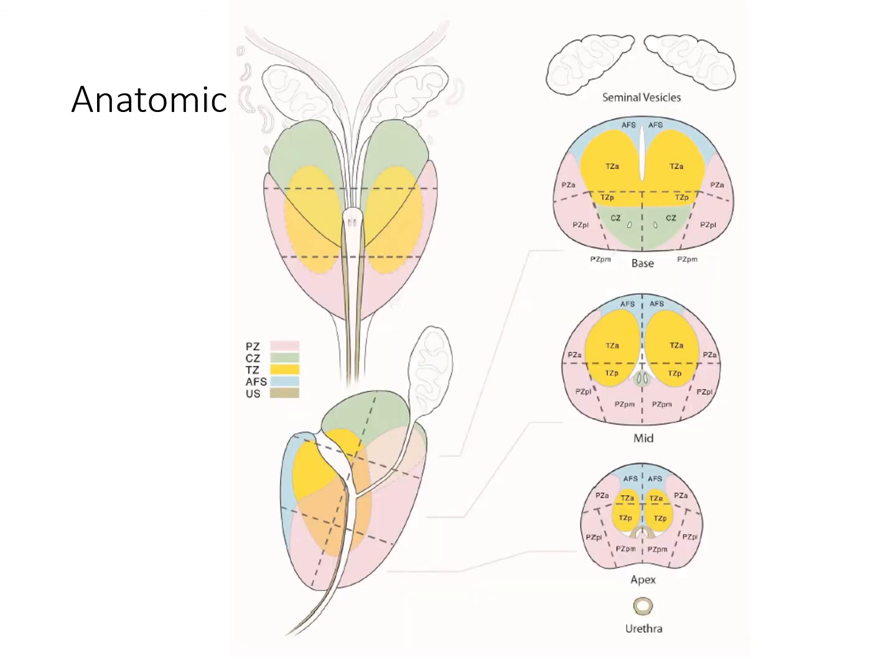Okay, so the next important thing which PIRADS emphasizes is the anatomical localization. They have this multiple sector map of the prostate gland, and when you describe a lesion, you should precisely localize it, and then you can mention this terminology to clarify which part of the gland you're in. This is a sagittal image and a coronal image, and these are axial images, okay? And that's the axis of the prostate.